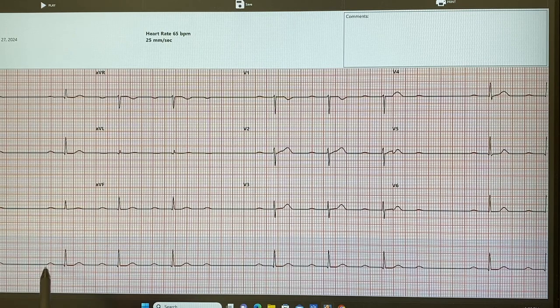Next. And then there's one here for QRS, one here for QRS, one here for QRS, and then this right here, but there's no QRS. Okay, so we have a non-conductive P wave. Next, we're looking at whether the PR interval is normal or prolonged.